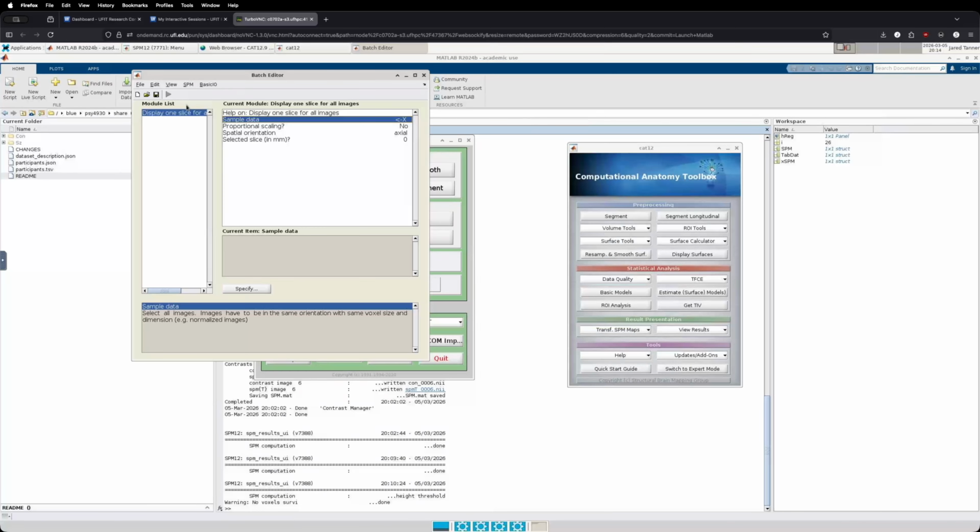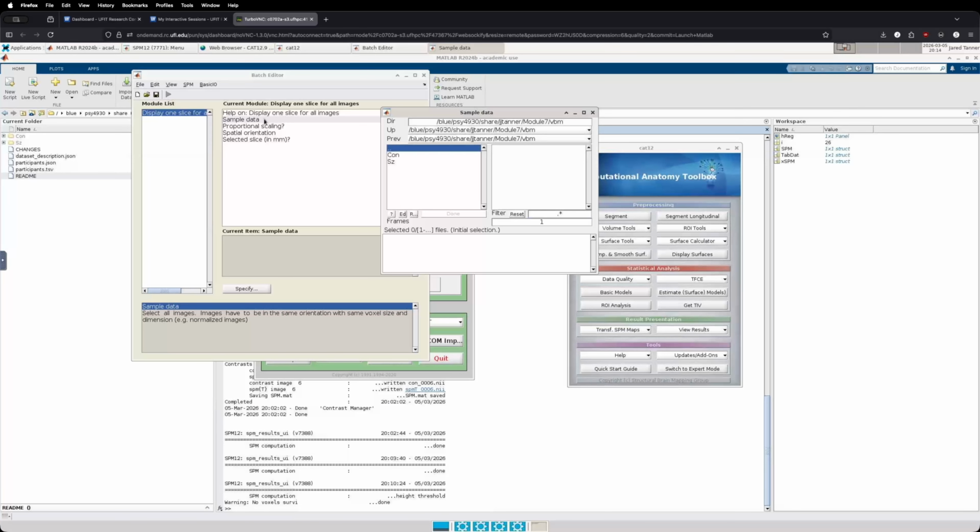And what I'm going to do is just look at all of the smooth data. So we can find that from our main VBM directory called SMWP1, and then you should have the dot asterisk there. Click on this REC, we should find 40 files. If you don't find 40 files, then something has gone wrong and you need to go back and process till you have the 40 files.